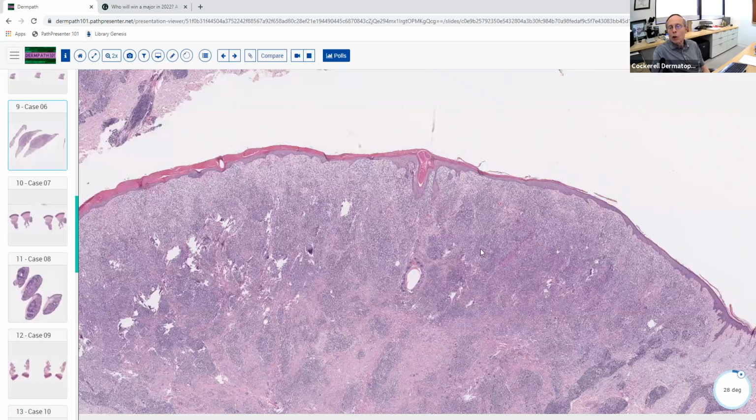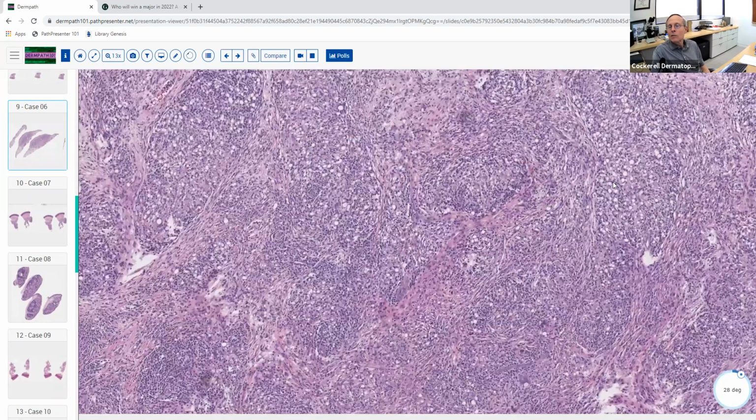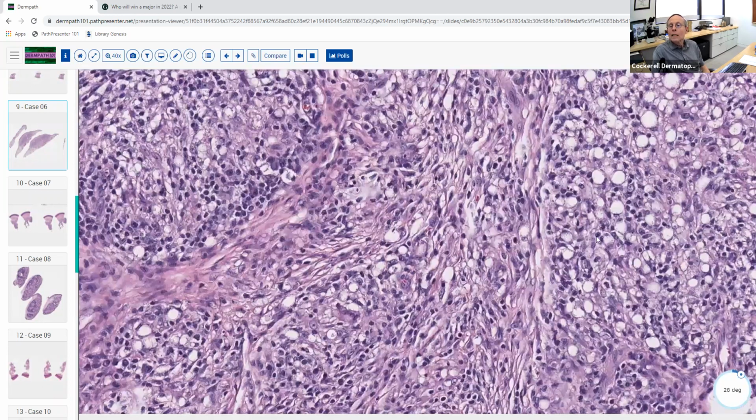So yeah, we can look and then say, well, let's look at the actual organisms. Histo doesn't give you the marquee sign, which is true. And the other thing, this doesn't zoom high enough, but if you really look very carefully, you can see that there's really no capsule around these organisms. You can actually appreciate the little capsular material around histo if you look carefully on H&E. And you can also tell there's a little tiny dot inside these organisms. You barely make that out here.